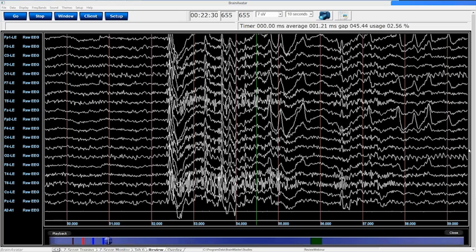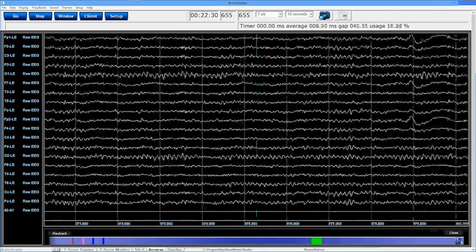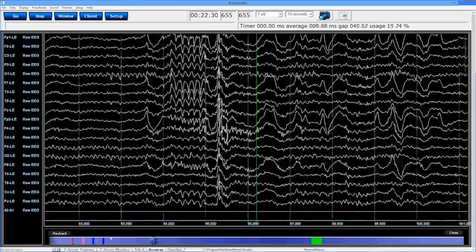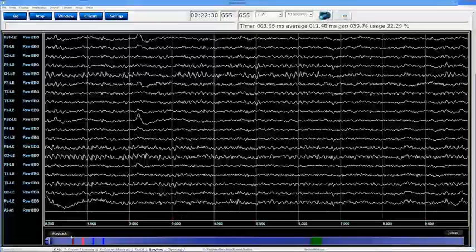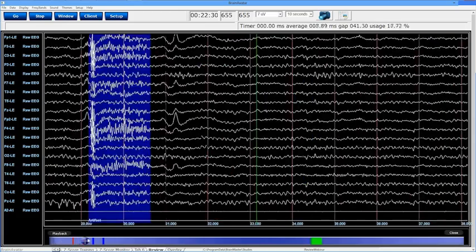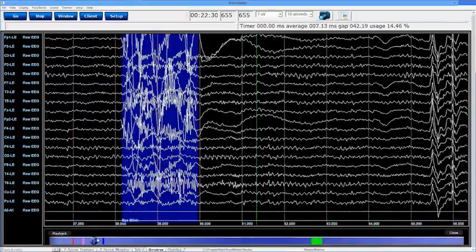Why do you want to mark the areas? That actually goes into the next section that we're going to cover on mark. The reason that you really want to mark these areas is because sometimes when you're playing back a file, right now this file is, let me look through it, I want to say it is about 381 seconds long. Now that's a little bit over 6 minutes. I don't always want to see every single bit of this information that I want to play back. If I did, I would just not even worry about annotating at all, and I'd just hit the playback button. But if I annotate this area, I'm able to pick and choose what I fully want to play back.